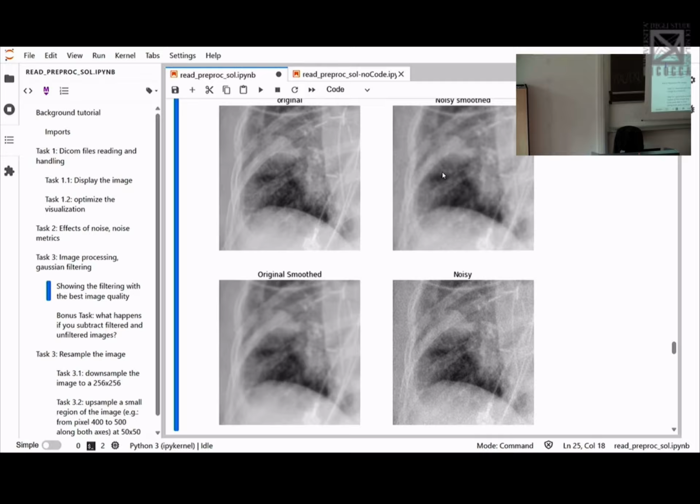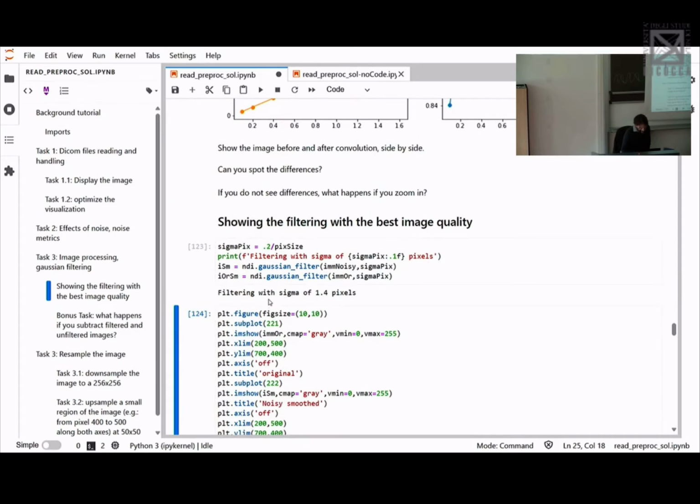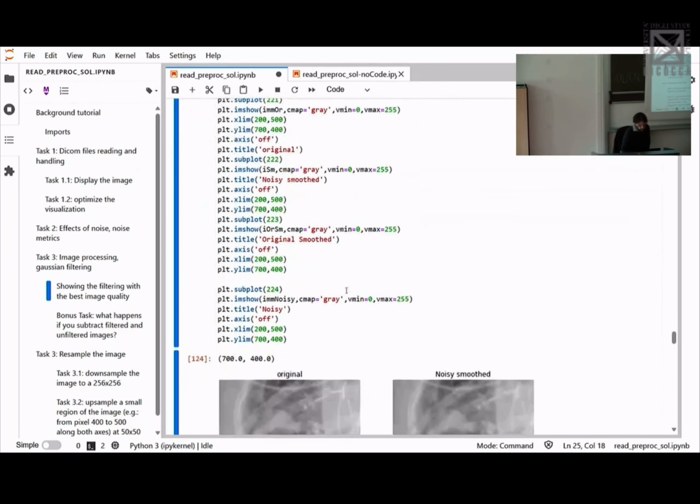We mentioned in the previous lectures that our brain likes edges a lot. So smoothing is impacting the edges, and this is not something that we like very much. But we can still perceive most features. Keep in mind that I'm zooming in. Now, if I go to the original, I can see how I'm losing some details. Actually, maybe too many details, but I don't know. Well, the code seems correct.